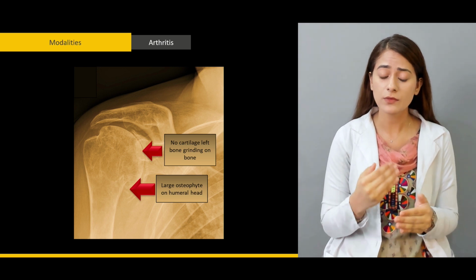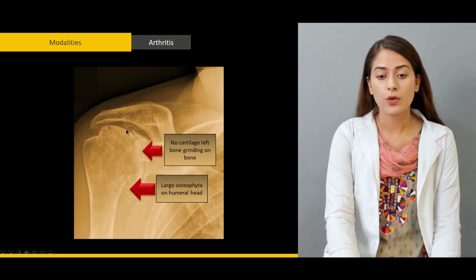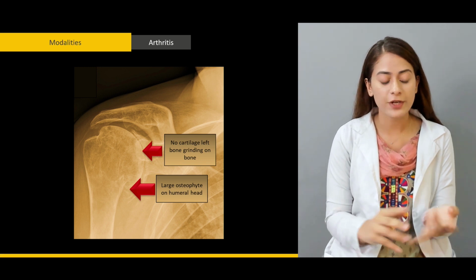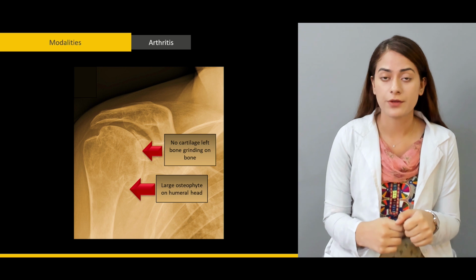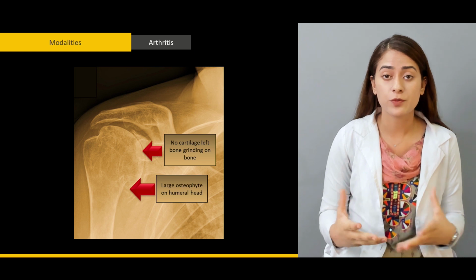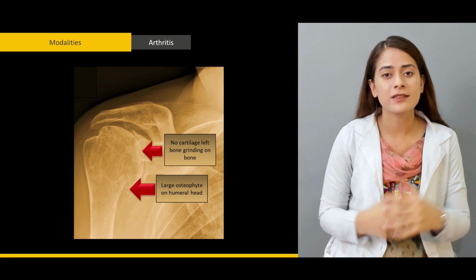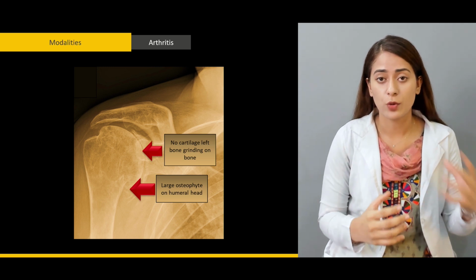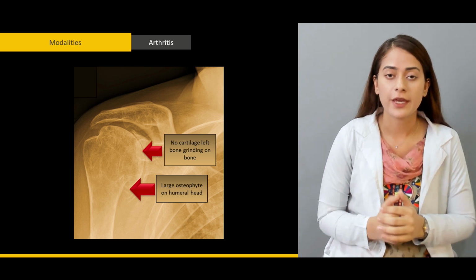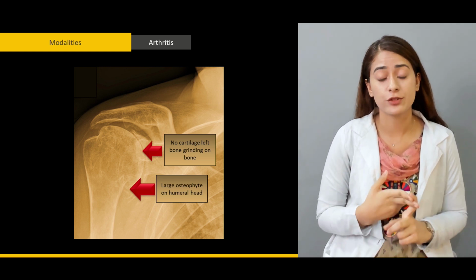So this is actually a radiograph of the shoulder, which is showing the degenerative changes or the degenerative joint disease of shoulder joints. So what happens is there are some characteristics of osteoarthritis. The first is there is joint space narrowing. There can be bony spurs. The presence of bony spurs, those are very sharp-ended bone formation in the tendons. Like I said, the bone formation or the calcification of tendon is never good. So they can be sharp and thus impinge the tendon further. So bony spurs, joint space narrowing.